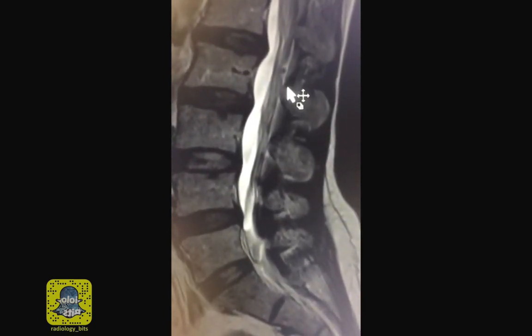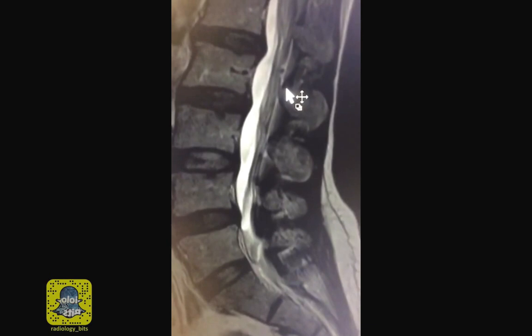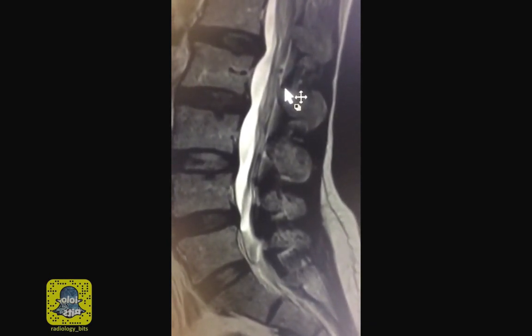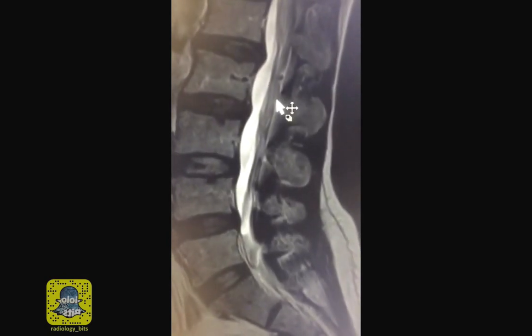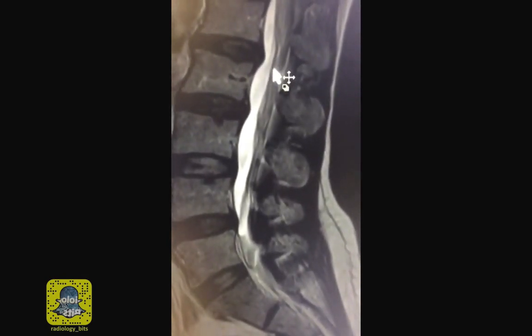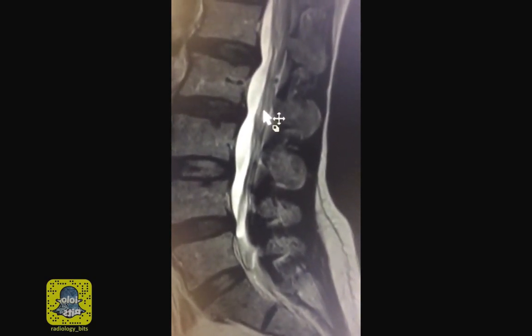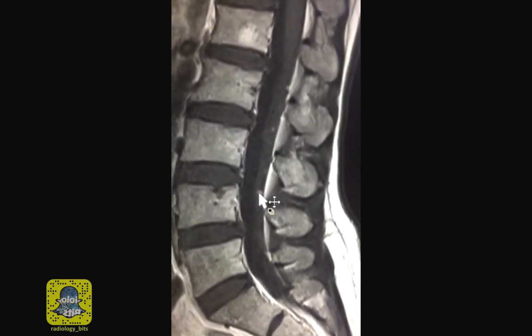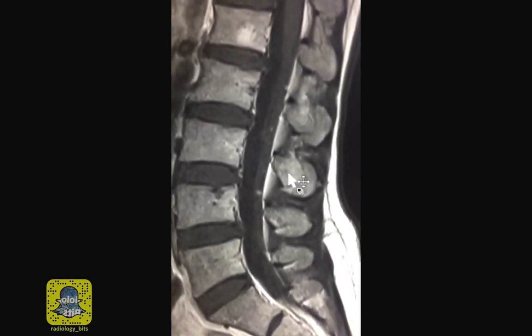This in itself is a very important teaching point for radiology residents. Remember that many lumbar spines are performed without giving contrast. And if you don't look carefully, these could be missed. The teaching point is make sure that the cauda equina nerve roots are smooth and linear without additional nodularity. So what's the differential diagnosis for multiple tiny enhancing nodules of the cauda equina?